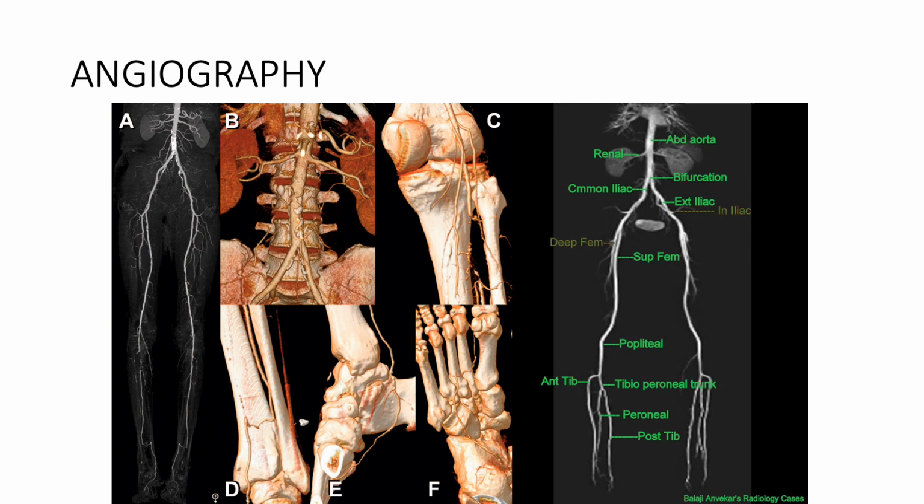In CT scan or MRI, you could also do angiography, but these are special features of the CT or MR, wherein the machine itself has a software to reconstruct the vasculature of a particular area of study by eliminating the other structures in the picture, like what you see in the rightmost X-ray picture, where you can only see the vascular tree of the lower limbs.